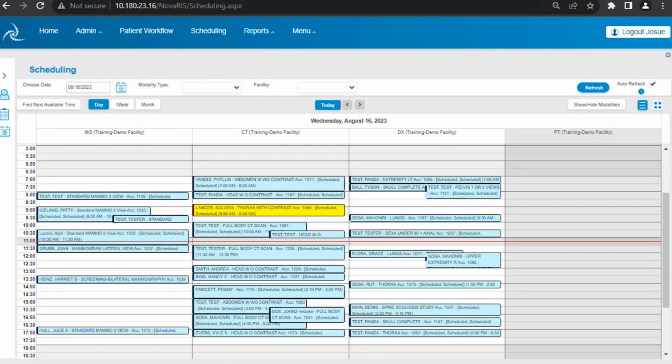Okay. So one of the things that Dina has shown you so far is that we have many ways that you can access information, and you can still do the same thing the long way. You can go into the menu, go into records, or go into procedures, edit procedures, or view procedures. However, there are some times that you will be wanting to use a little bit faster options to see the patient record, to see the specific procedure information, or if you want to look for that patient somewhere else, you can just go and copy and paste, right?